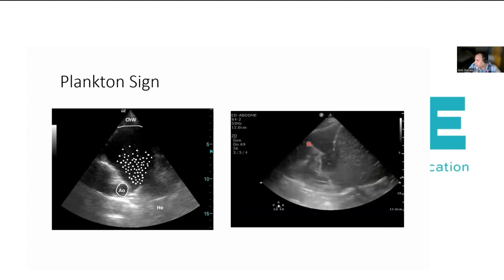You can see collapsed lung over here, which actually looks to be quite septate in a way, with some fluid areas around it. And actually some elements of fibrin strands are also seen. Now, this would be highly indicative of an exudative kind of effusion.